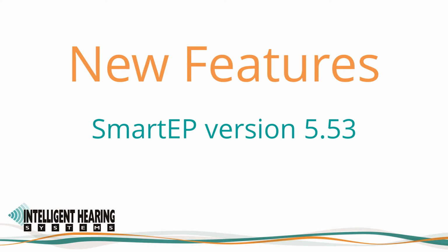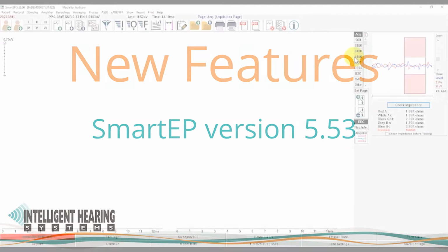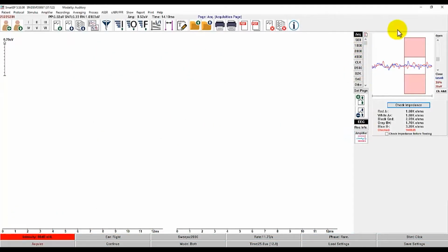Version 5.53 of the SmartEP has been released and incorporates some new exciting features and capabilities, some of which many of our users have asked for. This short video will walk you through what is new. If you're planning on updating your software, please be sure to read through the installation guide on the main update page and make sure the new software is compatible with your device and your computer.